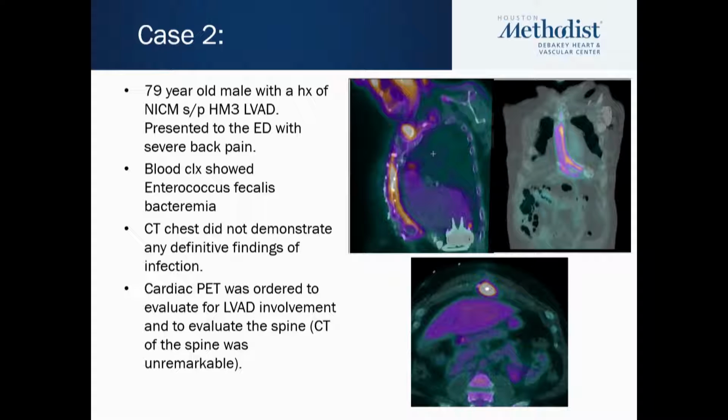So case number 2, this one is pretty dramatic. 79-year-old gentleman, destination therapy HeartMate 3 LVAD, also came in with Enterococcus faecalis bacteremia. That's kind of a theme in my talk, the Enterococcus.